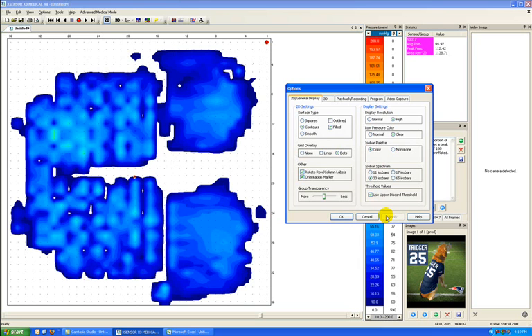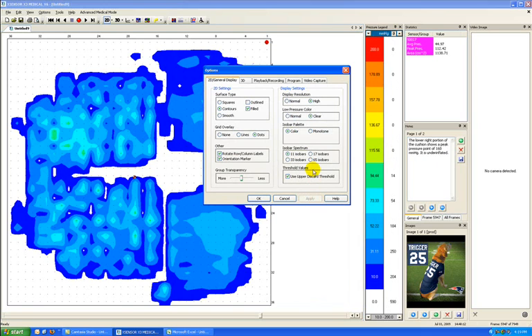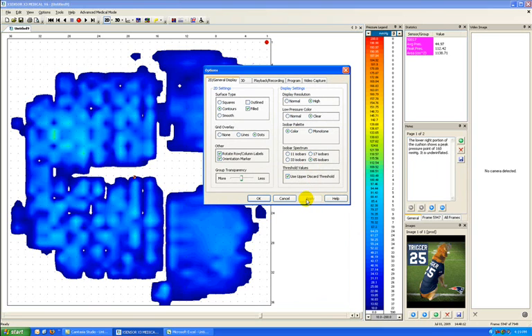For the isobar spectrum, I can change it to have different numbers of value ranges. So if I want to change the pressure legend down to only 11 isobars, I can move it down to only 11 ranges. Alternatively, if I wanted a finer analysis, I could apply 65 isobars, and there would be much different coloration of the pressure image and the pressure legend, with finer delineation between pressure ranges in which the values are falling.